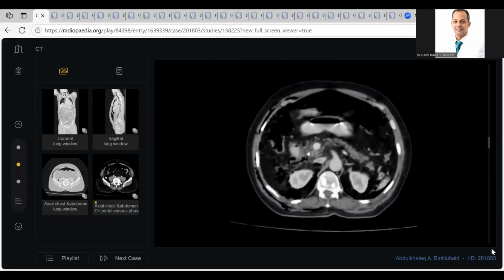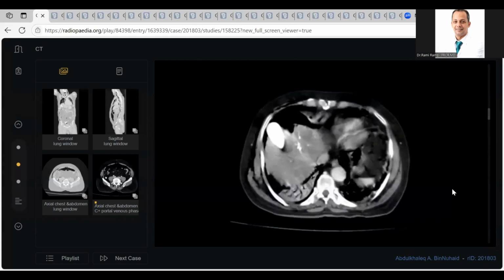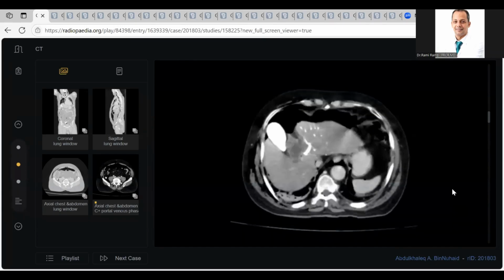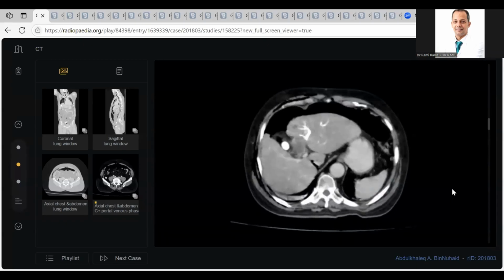The pancreas appears unremarkable. I would like to see the liver. Coincidentally, I noticed right lower lobe collapse also, and in the liver there is a heterogeneous area of low enhancement and attenuation around segment 4.